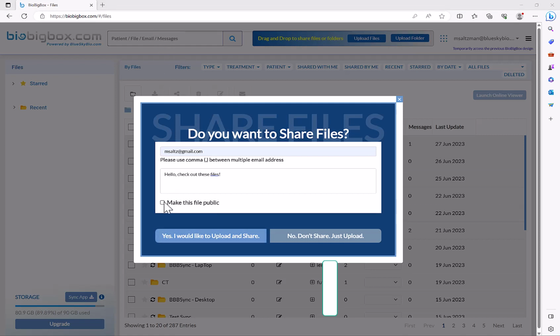Now we have this checkbox to make this file public, and the reason that we have that is that we have an intelligent sharing system. Because BioBigBox is HIPAA compliant, we want to make sure that only the people that you share the files with are able to access the files. Even if they get the share link for the files, we want to make sure that that share link only works for the relevant people that you've entered their email. So as I mentioned, we have the intelligent share link built into the system.